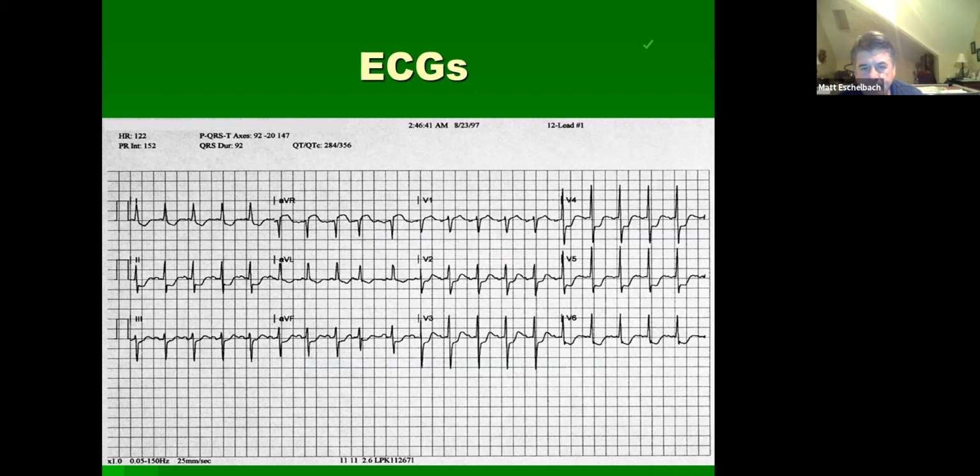It's a spoon. You have depression in 1. I can't hear you, Wes. Maybe get a little bit closer to your microphone. So it's more of a spoon, but it's depression in the leads, especially 1.